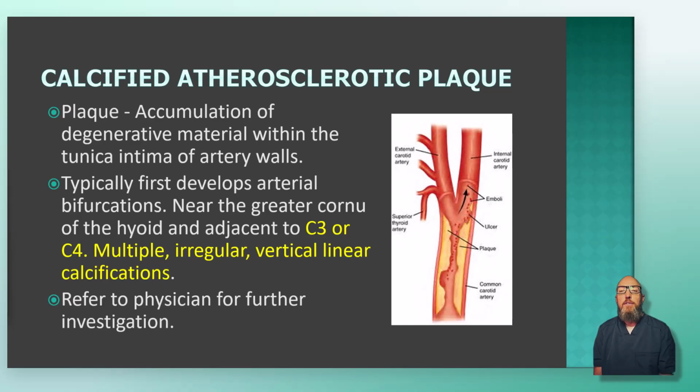And so we don't have a controlled study proving that calcified atheroma on a panoramic is an independent risk factor for stroke. So the honest position is you're not diagnosing stroke risk. You're finding something that warrants a further evaluation by a physician, especially a patient who already carries cardiovascular risk factors. So refer, but try not to alarm the patient.